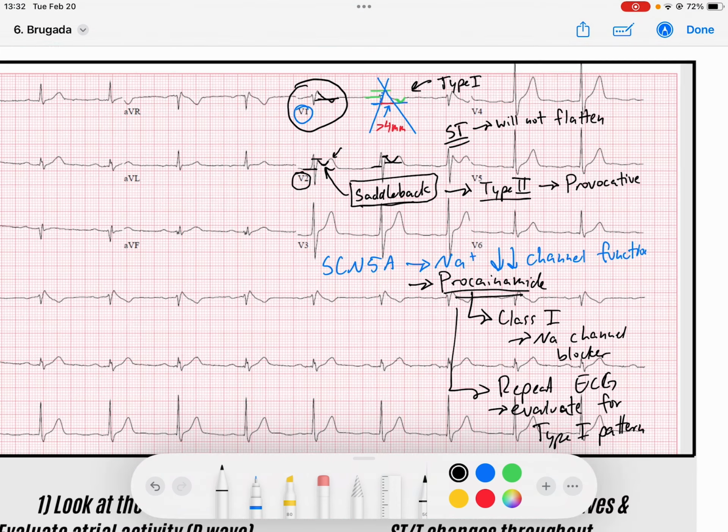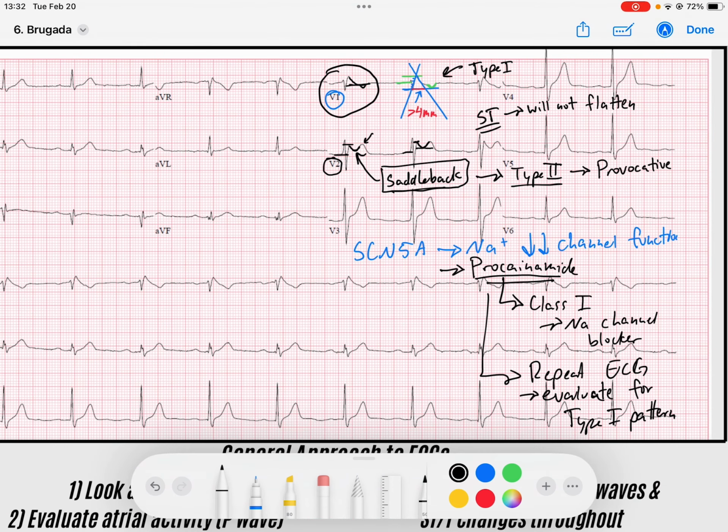Brugada type findings. And so you're probably all wondering, well, why is it just focusing on leads V1, V2, and V3? Well, remember that these leads kind of point towards the right ventricle. And there is some data, hypotheses that talk about maybe the most susceptible region of the myocardium is the right ventricle outflow tract, right? That maybe is what actually shows this the most on ECG, which is why we have findings of these things on V1, V2, V3.